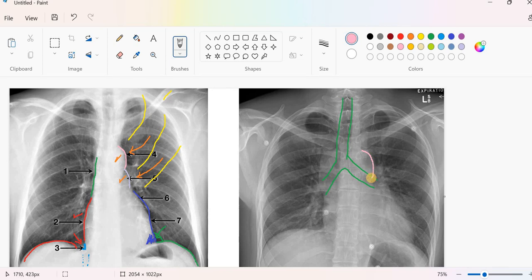If I wanted to confirm my assumption, let us again look at the ribs. Since we are commenting on the heart, it has to be a posterior anterior chest X-ray. So this is the first rib, since this is the clavicle, as is obvious. Then this is the second rib. So now we are really in the left intercostal space. So this is definitely the aortic knuckle.